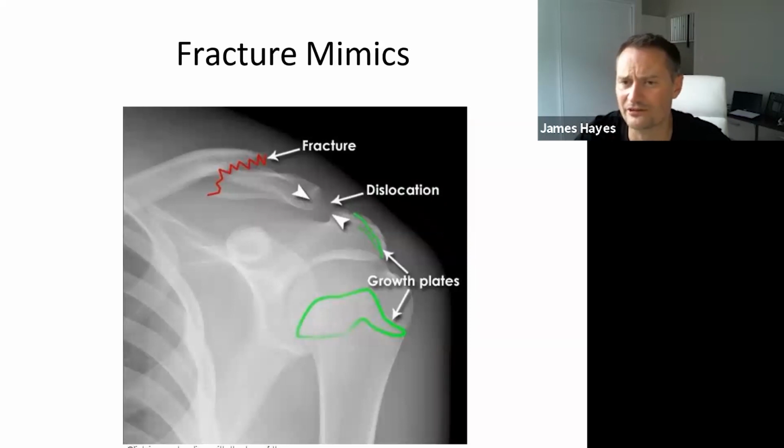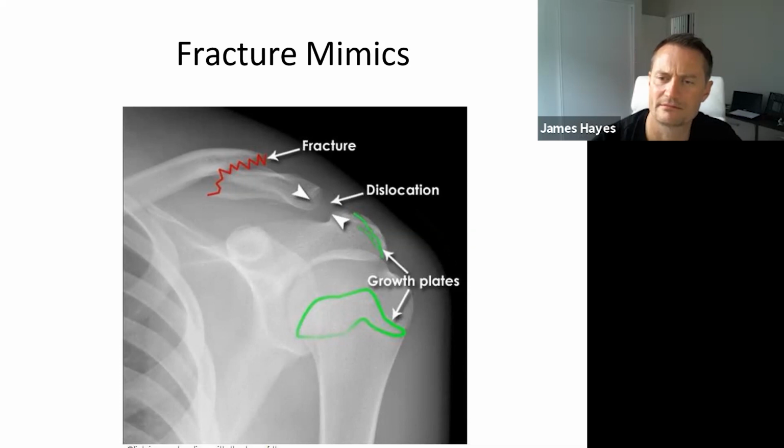Things that mimic fractures, okay. You've got growth plates. So again, in children, and I go back to my earlier comment that fractures look angry and normal bones look happy and round. So fractures are angry and angular, and bones that are growing have nice round edges. Interesting.